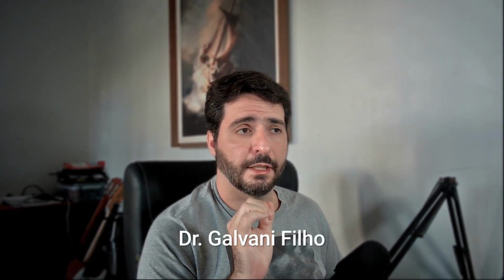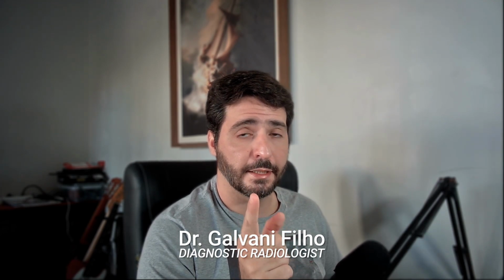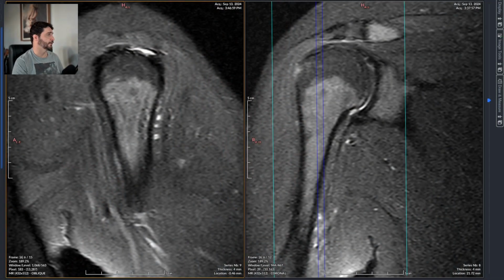So guys, I have here a left shoulder of a 48-year-old female patient who says she has some kind of pain due to a trauma event. So let me share the screen with you guys so we can enjoy the images as much as I.